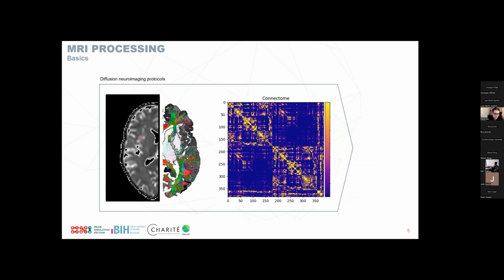We start with our raw DWI, diffusion weighted imaging. Again, same brain, but now it has the property of what is thought to be capturing the movement of water molecules in your brain, which again is interpreted as an approximation of how tracts are actually in our brain, right?